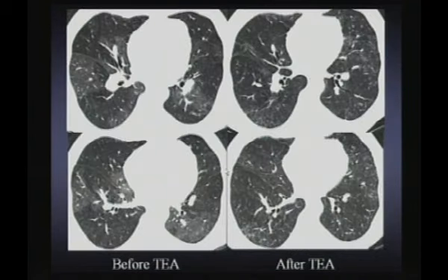And some of the most fascinating features are in the lung parenchyma. This is the mosaic attenuation that was present previously, and now we can see almost a reversal of this pattern as perfusion to the previously hypoperfused areas increases, and we start to get ground glass and small reticular changes occurring in the areas that are now reperfused.